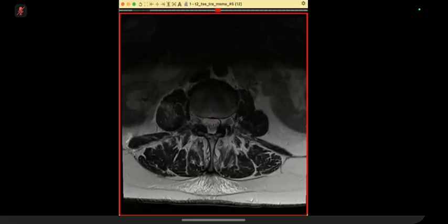So in the STIR images, again, I can see there is an abnormal high T2 signal affecting the right psoas muscle, which appears swollen as compared to the left one. I'm trying to scroll to check if there is any perivertebral abnormality, but I think I have to request again. Kindly, doctor, can you scroll for me only? I need to check the page. Just 1 second.